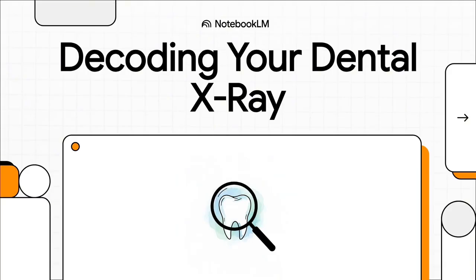You know that moment in the dentist chair where you glance over at that black and white image of your teeth and it feels like you're trying to read some kind of alien language? Well, today we're going to crack that code. We are going to demystify what your dentist is actually seeing.